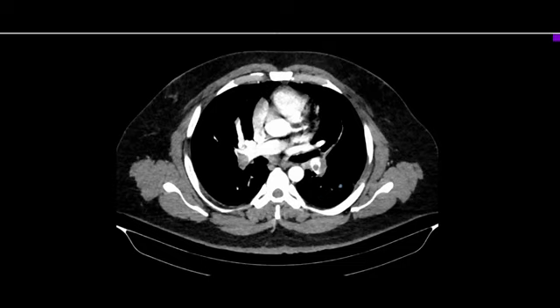Coming to the chronic thrombus, if you see a vessel is completely occluded but the caliber of the vessel is narrower as compared to the adjacent patent vessels, then it is a case of chronic thromboembolism. Or if there is a partial occlusion, then the thrombus will be in the eccentric part forming obtuse angle with the vessel wall, and there will be signs of recanalization and organization like fibrin strands or calcification.